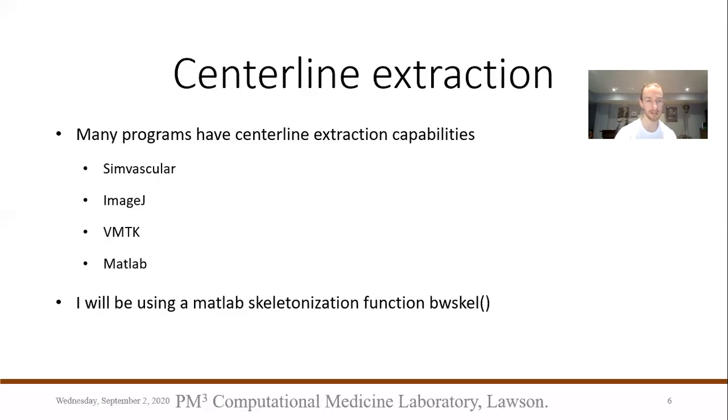Now, centerline extraction. There are quite a few programs that have centerline extraction capabilities. Basically it's going to be drawing a line down the length of the blood vessels within your image. And this has applications for blood flow simulations and a few other applications.